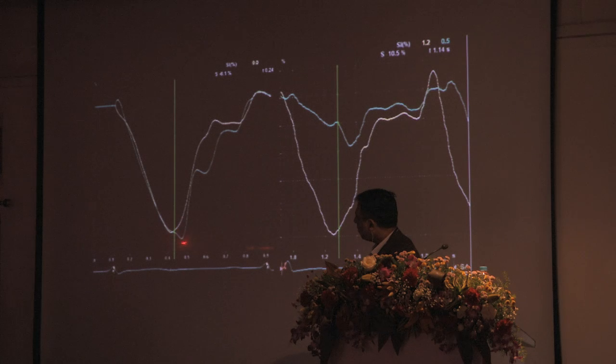If there is strain after the aortic valve closure, what does that mean? That means that there is some segment of the heart which is contracting at the time where everything else is relaxing. Okay. And here you can see this is a normal strain, and you have a little bit of post-systolic shortening, which is okay, which is normal, because this strain curve is normal. This is seen in 30% of our myocardial segments. However, this curve is abnormal. Okay. You can see that this is a normal strain curve versus this strain curve, which is after the systole, is abnormal, and the amplitude is also abnormal.